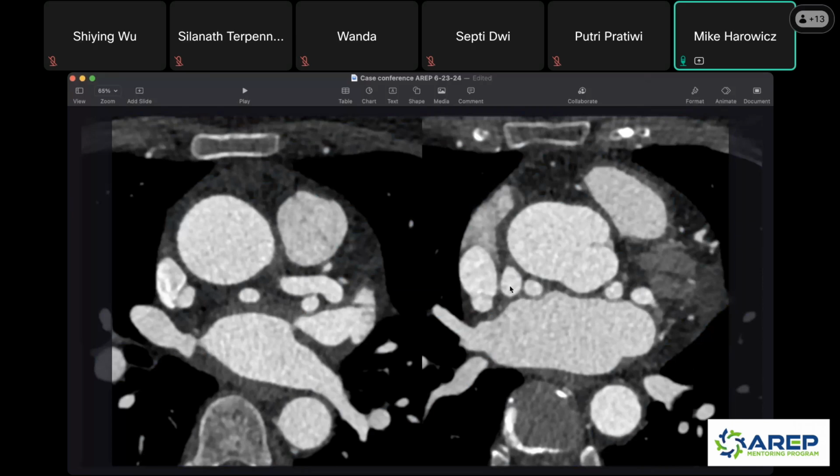By decreasing your field of view and really honing in on the heart, you also get better spatial resolution here, right? To step back for CT for a second, what you see on the screen is just a bunch of what we call voxels, right? Imagine a grid overlying your screen. Those voxels stay the same size. So if I focus on a patient's whole body, right, there's multiple structures getting into each voxel. But if I pick my field of view and I make it very small, you can imagine there's smaller pieces of anatomy that are fitting into that voxel now. And so you can delineate structures in that area very easily, or more easily compared to a big field of view.